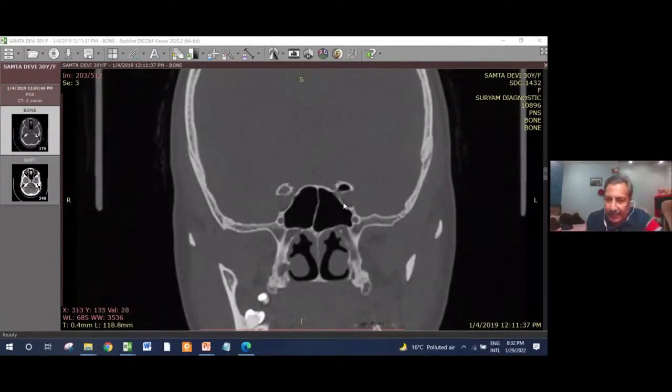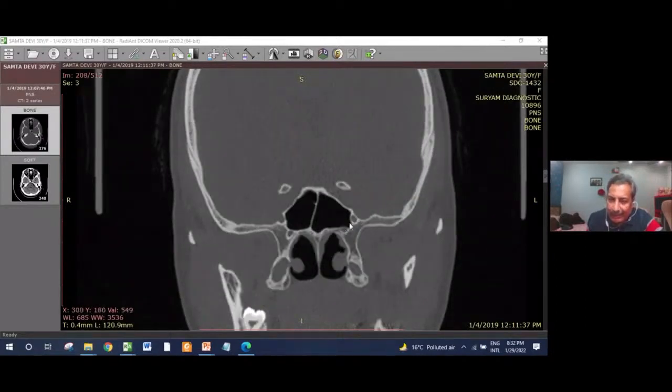Here is the superior orbital fissure, and this is separated by a bone, that is the maxillary strut, and this is V2. V2 and the vidian canal form two important landmarks in this region. If this pterygoid bone happens to get pneumatized by the ongoing pneumatization of the sphenoid sinus, the sphenoid is normally centrally pneumatized, but in more extensively pneumatized sphenoid sinuses, this pneumatization extends into the surrounding bones, and if this pneumatization involves the pterygoid bone, then it is known as the lateral recess of the sphenoid sinus.